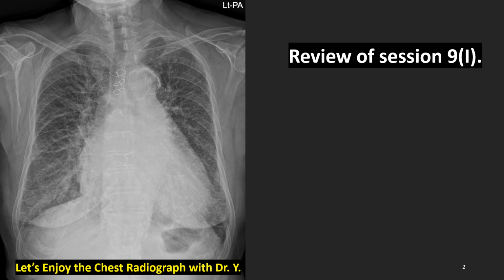And third, vascular cuffing. And interstitial edema. And then many Kerley's B lines. And also we can find some small pleural effusion. Very good. Yes, this is the case of congestive heart failure.